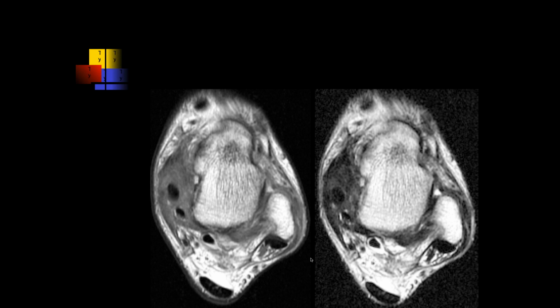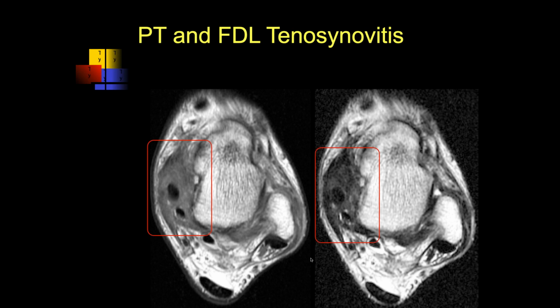Okay. So, do you know any history on this fellow? I don't remember it. I knew it at the time, but I don't remember it now. Yeah, but you don't see any space around the tendon. All you see is dark tissue, whatever that may be. Right. But if it's scar tissue, then nothing moves. Right. Well, that would be a frozen ankle. But it says here tenosynovitis, which would allow motion. Yeah, I don't remember. I'm just asking. I didn't really examine the patient. I think that it wouldn't allow much motion with the PTT, but it would allow motion in other areas within the ankle. But I don't remember the details in this particular patient.